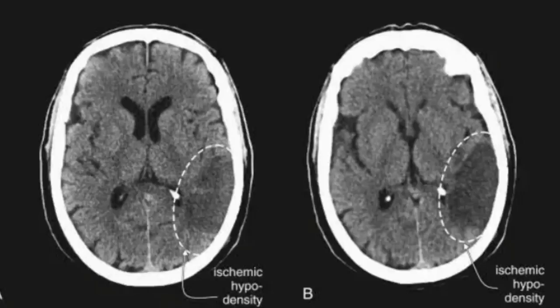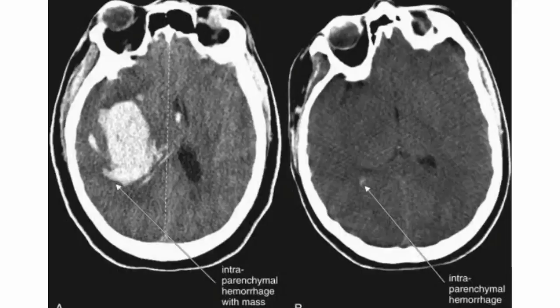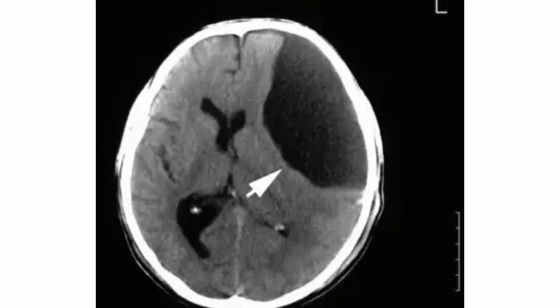If it appears black, we call it hypodense. Examples of hyperdense lesions are calcification or bleed, and also bone appears hyperdense or white on the CT scan. While things with a black or hypodense appearance are like infarct, like CSF, like any cystic cavity. They will appear as darker or hypodense lesions.